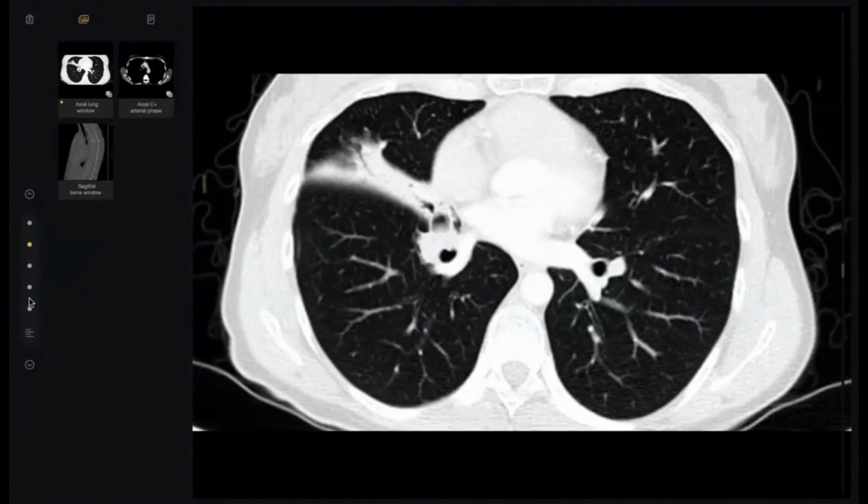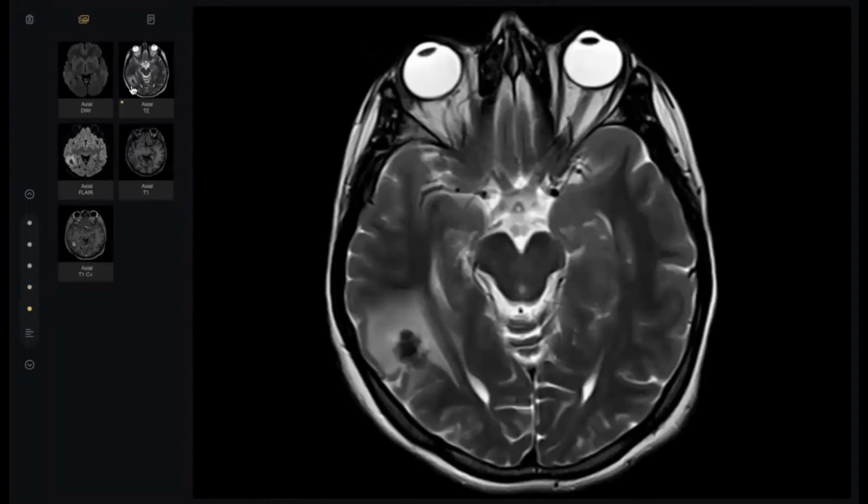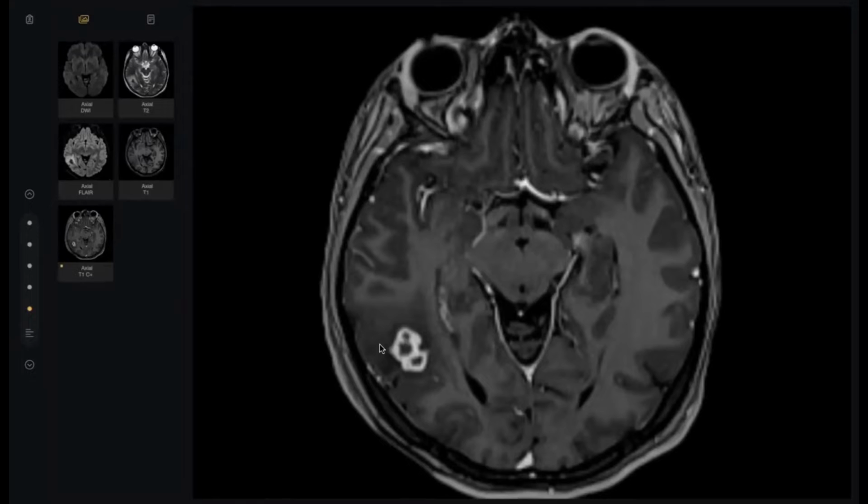And then we did CT of the brain: a slightly hyperdense lesion surrounded by edema. Then after MRI, the clue is in the T2, dark, dark. It may be calcified or hemorrhage, but it enhances. So tell the examiner both possibilities. It looks like blood-borne pathology. I will put metastasis versus infection. Even if you didn't say TB, I think the examiner will pass you, but it is better to say TB.